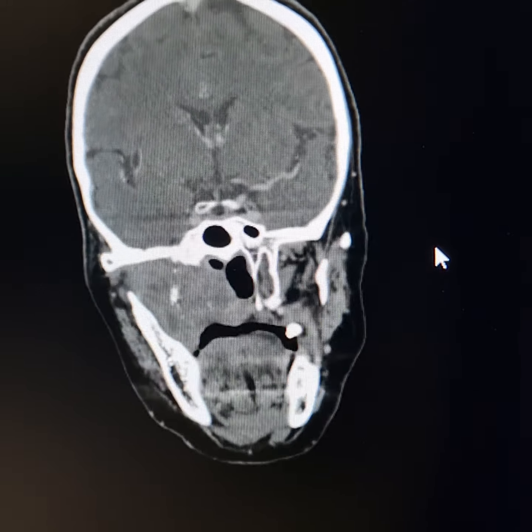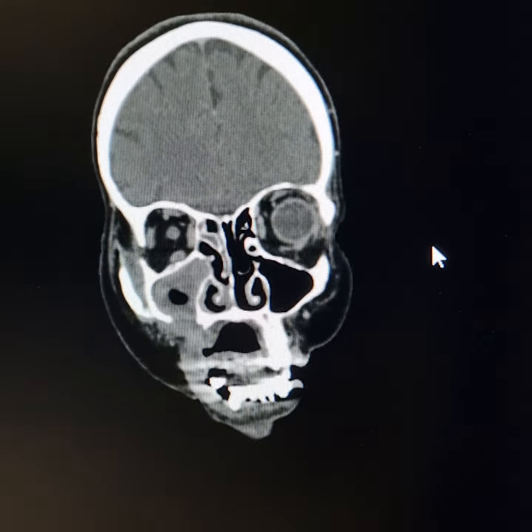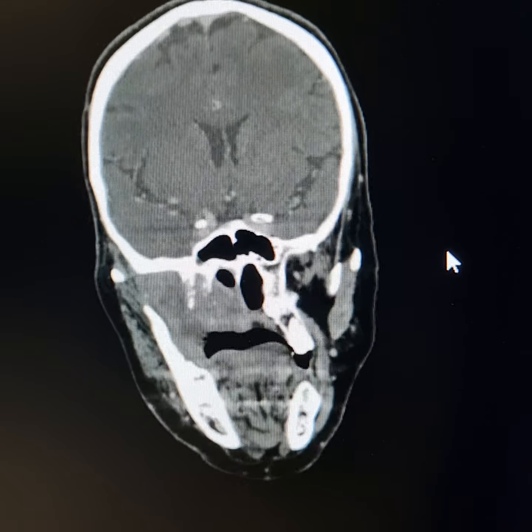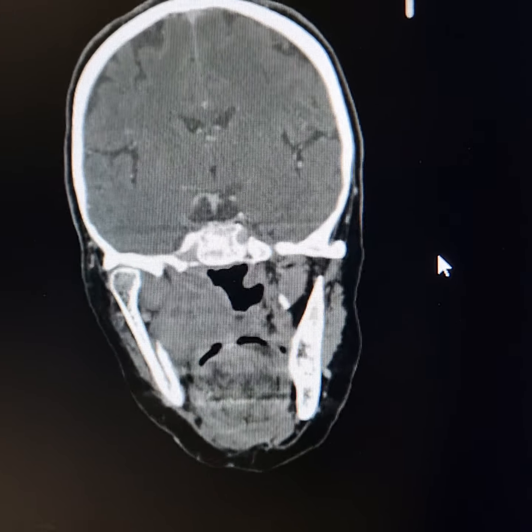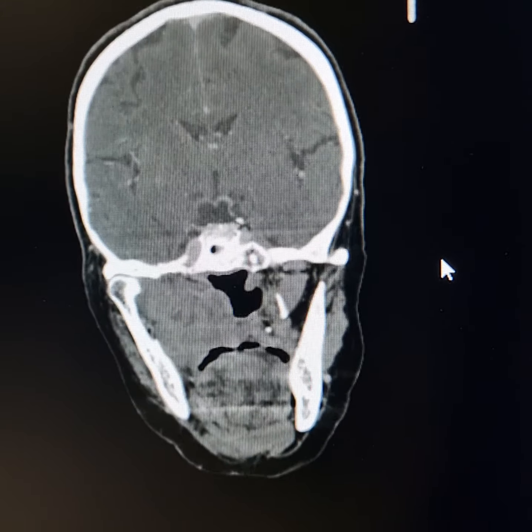So to me, this looks more appropriate, that we describe the mass first and then the total extent of the bone erosions in a sequence that the surgeon comprehends the true extent of the lesion just the way we are looking upon it.